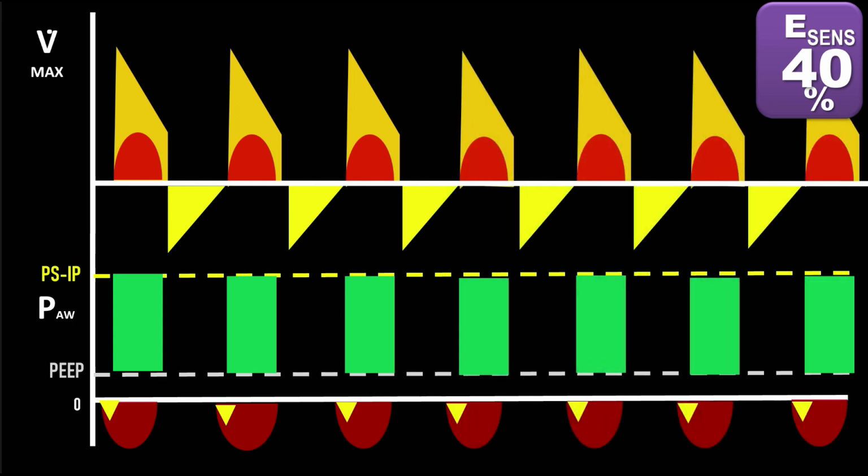And you can see here that the patient is taking far more breaths, and those breaths are syncing up much better. So the patient has rapid breathing, and we may have to assess whether the patient is distressed or it is rapid shallow breathing, but at least every breath that the patient is trying to take, a breath is being delivered, which means that the workload of breathing is reduced.